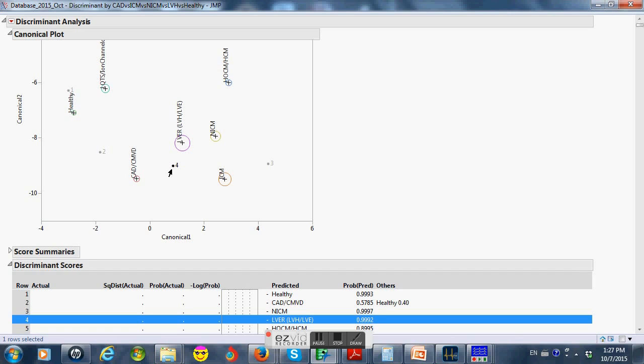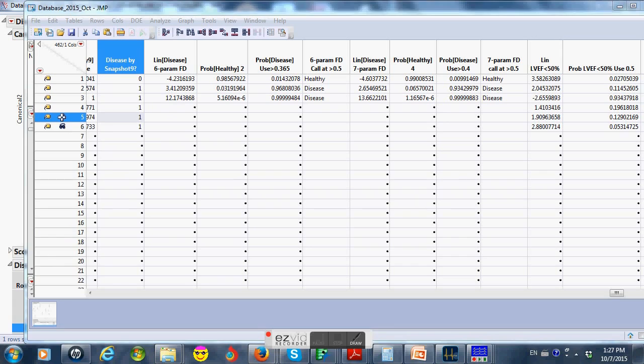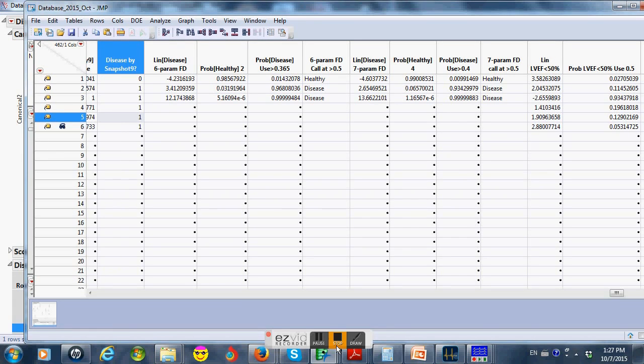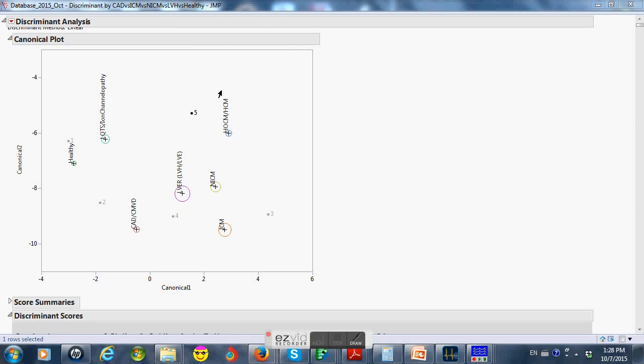Let's go on and take a look also at number 5. Remember, number 4 had positive disease scores as well by the logistic snapshot score. Go in and look at number 5. This was the person who had borderline conventional ECG criteria, Cornell Voltage criteria for LVH, a 39-year-old male. And other than that, though, there wasn't much, maybe some T-wave changes.